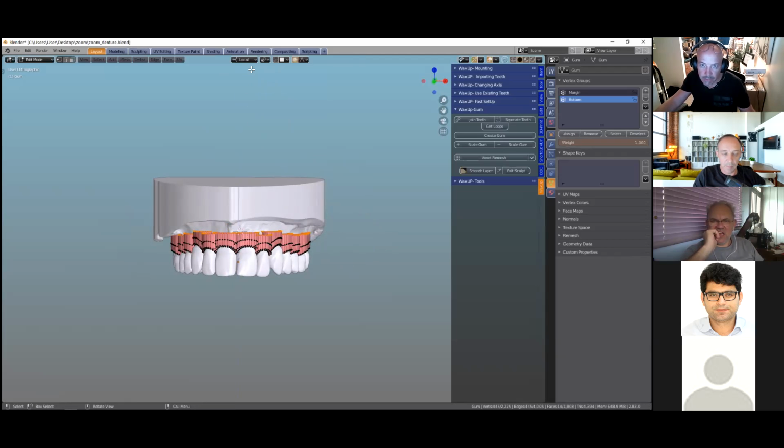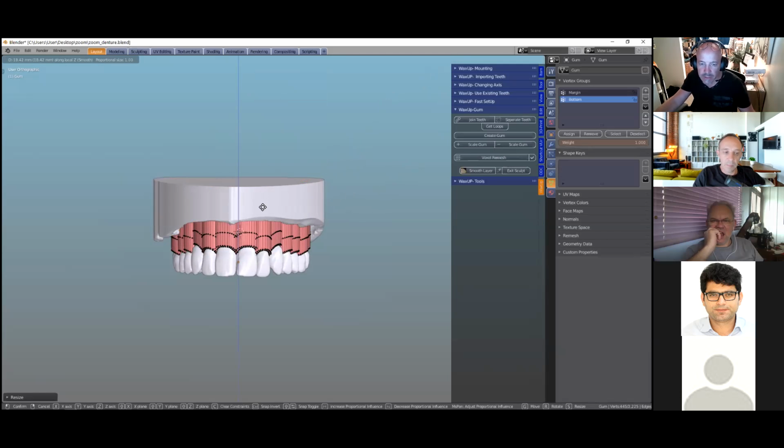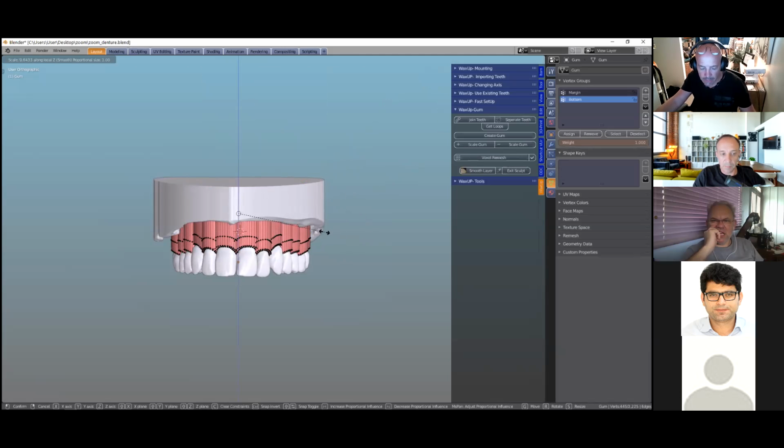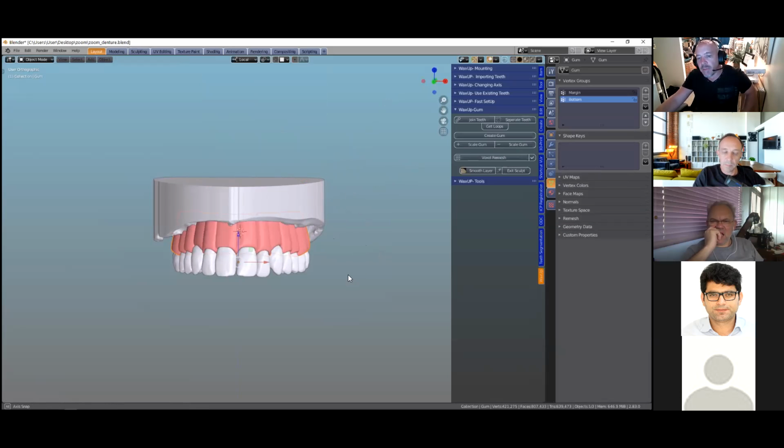Oh, what's happening now? Done something wrong. Nope. Doesn't want to work. GZ. Okay, I was hitting the wrong button. Just put this on active element. Scale. Yeah, this is what I wanted.